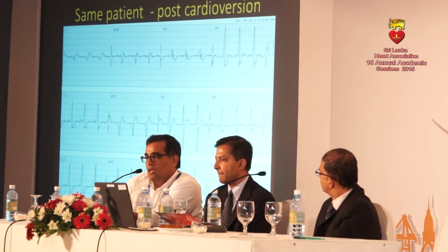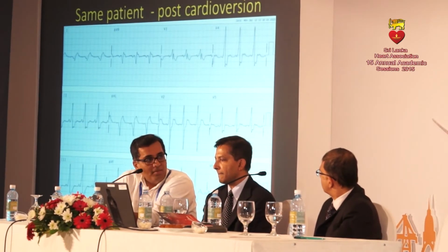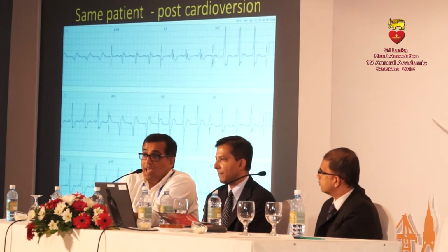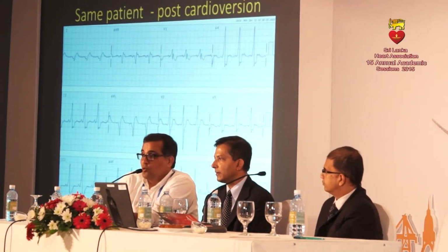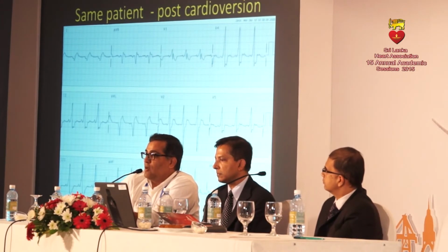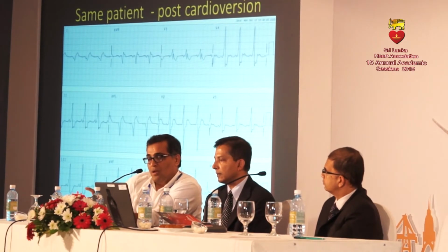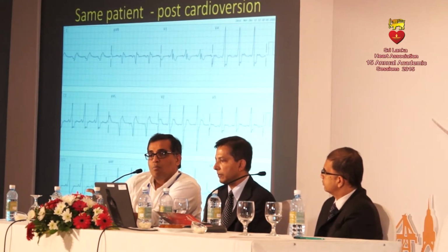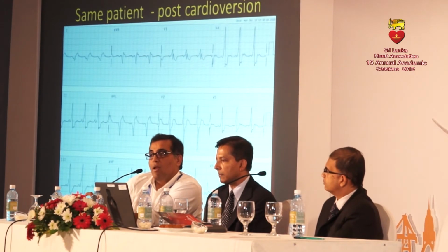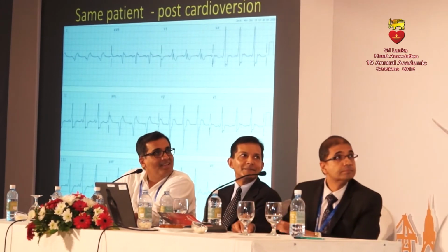But interesting enough, the positive lead 2, 3, AVF actually have a positive delta wave, which opens up the question: does this patient have an extra pathway in that location? So there could be, when they're in sinus, you're seeing evidence of an anterolateral pathway. When you're doing an orthodromic tachycardia, you have evidence of a posterolateral pathway. So that is something that you've got to be aware of. That's right. Good point. I thought that you might notice that.